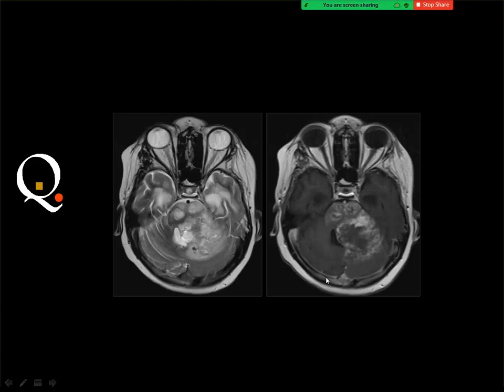First, before we mention metastasis, you should specify the primary lesion that can arise here, especially if you do not have in the history or in the images some findings that can lead you to say that these are metastases. Nothing in the history and nothing in the images.